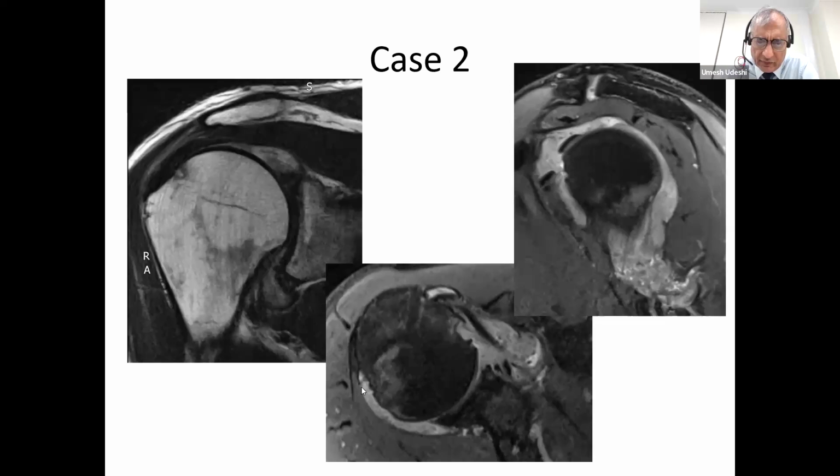And then these axial, and that's a sagittal, are very abnormal because you've got bulging of the joint, but it's full of gray stuff. There's a bit of fluid visible here and there, but it's mostly full of gray stuff in the joint. So what is that? What's all that gray material inside the joint space? Yeah, we've got a diagnosis here. That's synovitis. Gray stuff in a bulging joint is very, very thick synovium.